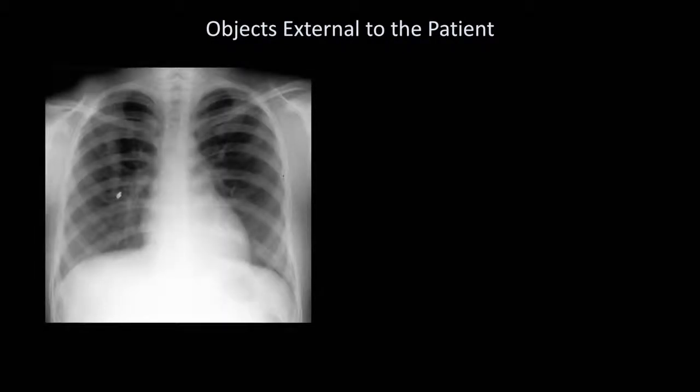There's obviously a very dense, small thing seen right in the middle of the right lung, but if you look closer, you'll also notice a superimposed, large, vertically oriented linear opacity. For those not sure what I'm talking about, let me outline it. What is this? Luckily, the radiology technologist noticed it and realized that it corresponded to the patient's hair braid.